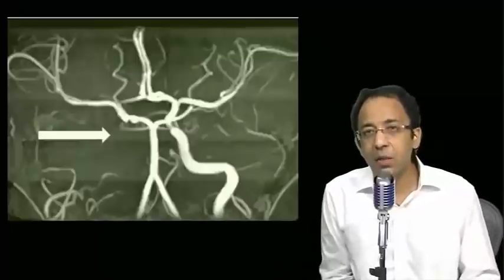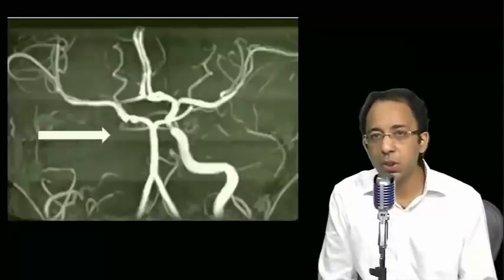Thrombosis here, and you can even see there is orbital apex involvement here. So this is how the normal side is. This orbital apex is involved, the cavernous sinus is involved, the ethmoid sinuses and the nasal cavity are filled. So that is one of the important things to look out for on an MRI when we are looking at a patient with mucormycosis.